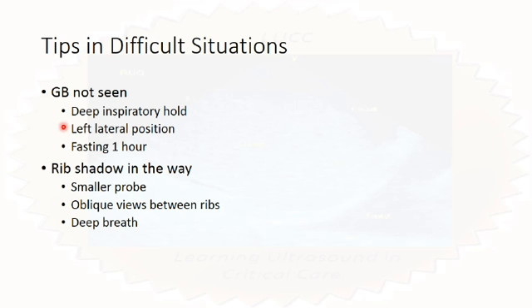Okay, fasting the patient for just 1 hour will increase the size of the gallbladder. Okay, and often what you'll find is that the radiographers will ask you for 6 hours of fasting, and if the patient is not fasting for more than 6 hours, they will often refuse to do the scan in the first place. We can try. Sometimes it's an emergency, you don't want to do that. At least if you can't see the gallbladder, try repeating it after fasting them for an hour or so.